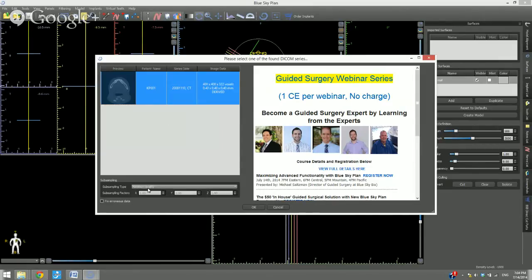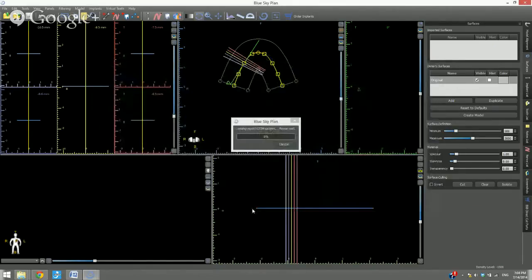One thing that's important here is the quality of loading. Generally, it's a good idea to put on maximum quality. If your computer can't handle it, then you could go down to medium or to low quality of loading DICOM images. Today DICOM images are such high resolution, it could be a quarter of a millimeter or so. If you go down to a lower quality, the software will automatically compensate for it. Generally in the software, we see things that are 1 millimeter apart, and you won't have any problem with it. After you have your quality selected as you like, press the OK button.